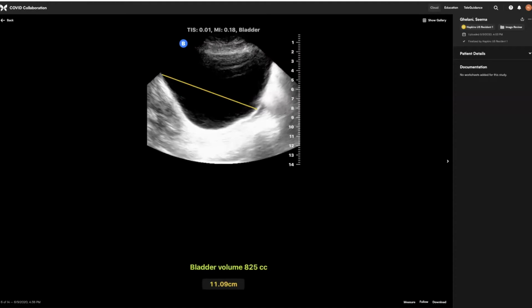The other issue is, and I think I would have had the same feedback if I were quality assuring this study, around posterior acoustic enhancement, but you and I throw that term around, I'm not sure everybody would know what that is. So, as the ultrasound wave passes through a fluid-filled structure, the amplitude of that wave doesn't really get attenuated. Ultrasound travels tremendously well through water.